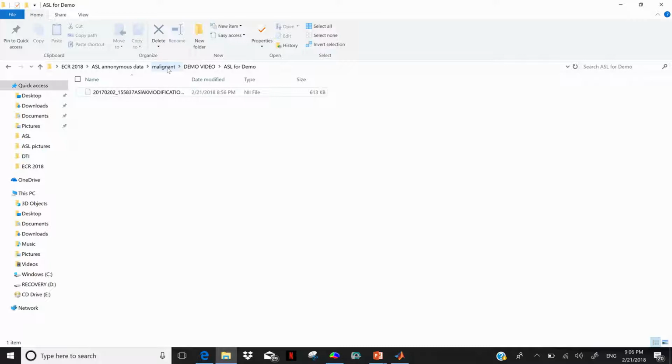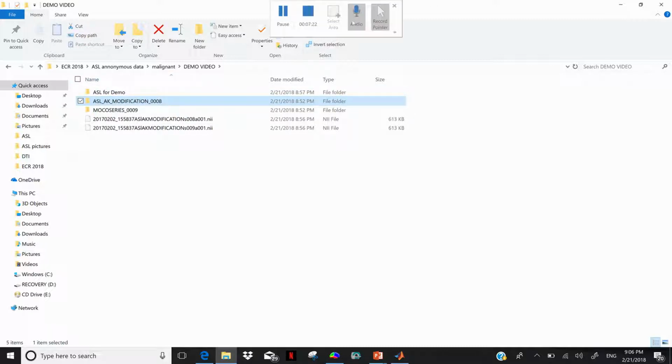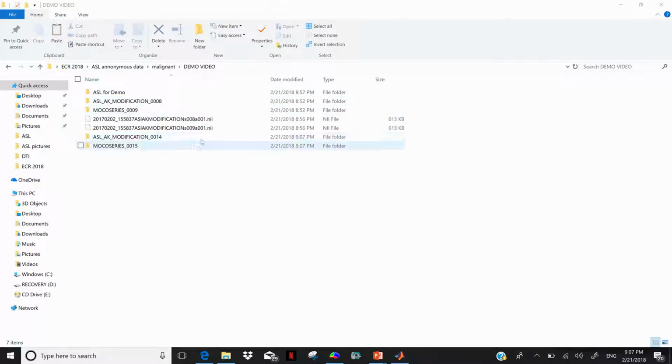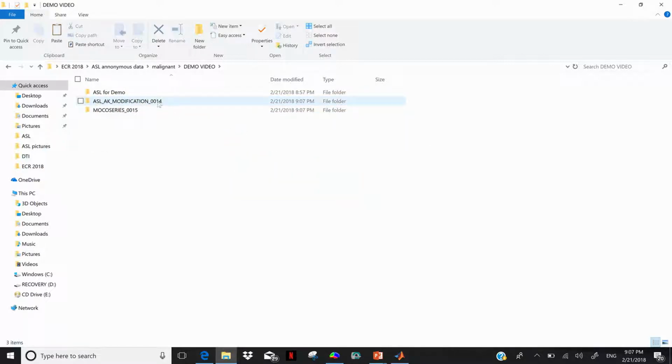So for example, here is our data itself. So just bear with me. I will just go back and get the full data. So now what I have done is I have copy pasted this to the series here, which we had taken later when we realized that we hadn't gotten the whole data. So this is very important. Sometimes the sequence might just stop and you might end up not having a complete set of images, which is very bad.